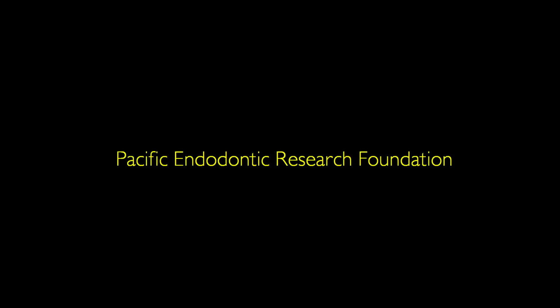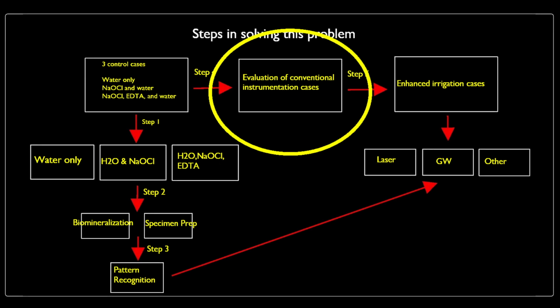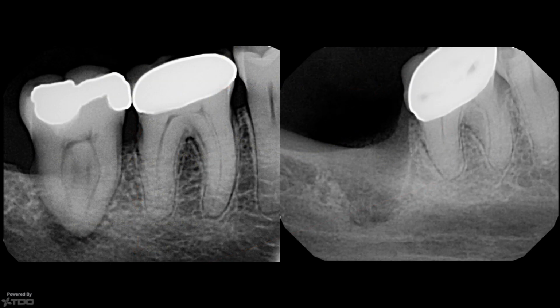This is a continuation of our tutorial on investigating conventional irrigation and instrumentation cases. This is Pushpak's case number 2. It was a lower second molar. The radiographs suggest the presence of a radiolucency. Cone beam images were not provided, unfortunately.